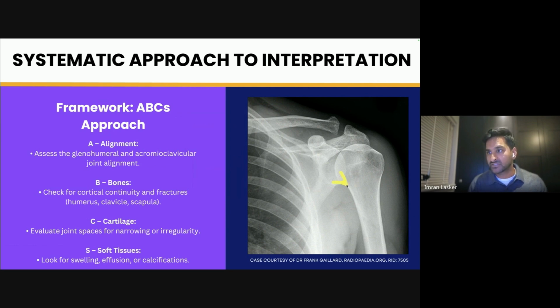And the way I do it is I draw all the way around, and I keep looking for any jagged edges or anything like that. I draw around every single rib. Now these are the posterior ribs, and they curve around and become anterior ribs. Posterior, lateral, anterior, and you do that all the way down. Make sure you can see every single rib.